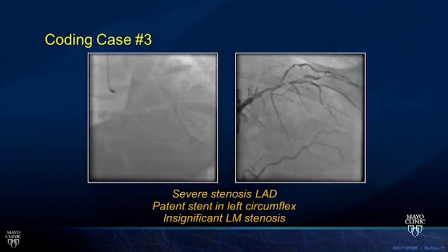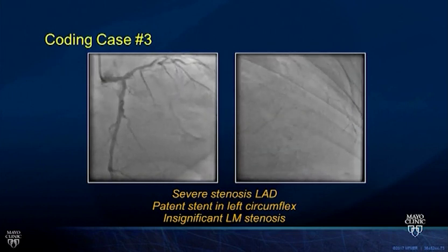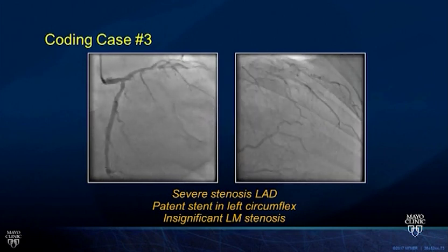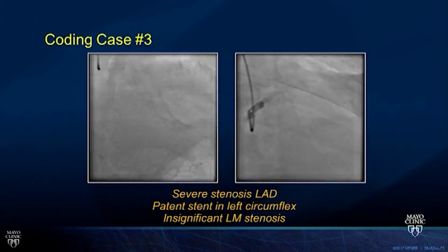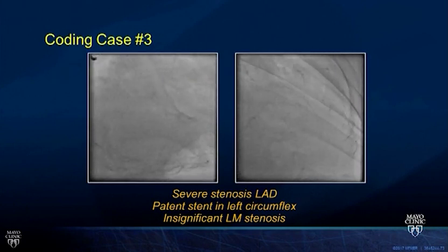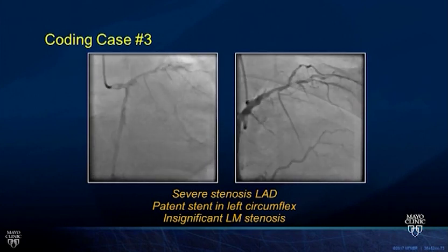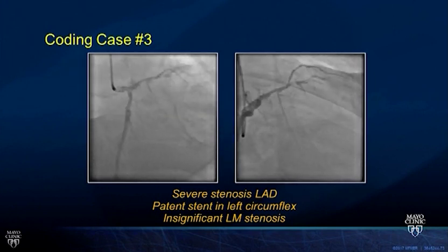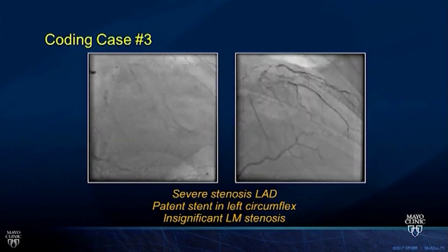So someone asked about the OM in the circumflex, and I think there is probably some mild disease in the OM, but I thought it was probably not really the focus of the angiogram, so I try not to overcode in general.